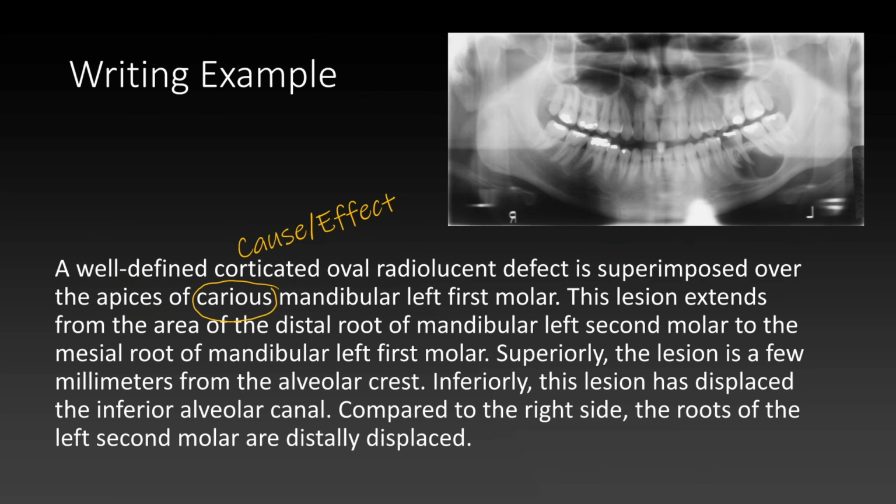This word is telling us the cause of the lesion. We are describing things that are happening adjacent to the lesion. Now we are already making a radiographic diagnosis of a radicular cyst associated with a pulp-exposed mandibular left first molar.